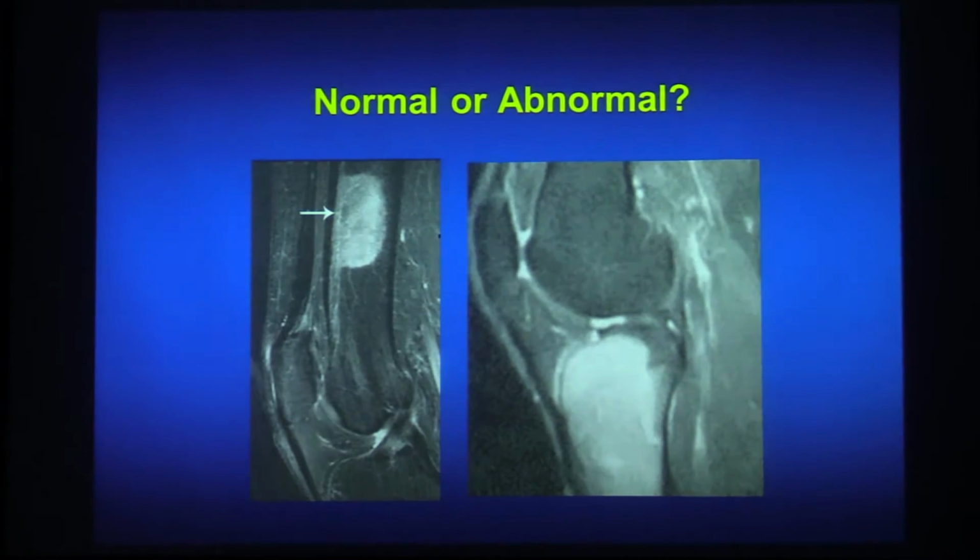So we come back to this basic question, and now you have some criteria for looking at these things. Number one, these are fat-saturated T2 weighted images, so you're probably going to say, well, you gave me a lot of criteria to look at on a T1 weighted image, so that would be the first thing you might do. And also when we look here, we see that the abnormal signal is extending into what should be normal fat in the epiphysis, and so we know that we have abnormal marrow infiltration. This is again lymphoma on this side. This is just very pronounced red marrow in the diaphysis.